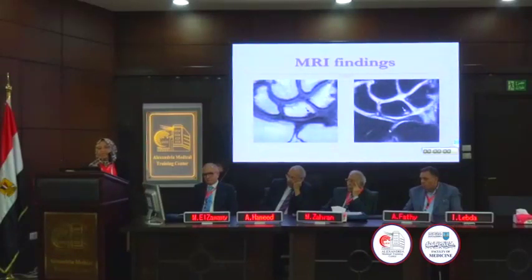By the way, it's better to comment on the ulnar variance by plain X-ray, not by MRI, because by plain X-ray there is adequate positioning of the patient and the patient rests during acquisition. And this is better to be able to comment on the ulnar variance. But with MRI, we have here neutral variance, and we can identify just bone marrow edema at the underside of the lunate with no other appreciable abnormalities, and even the triangular fibrocartilage is intact.